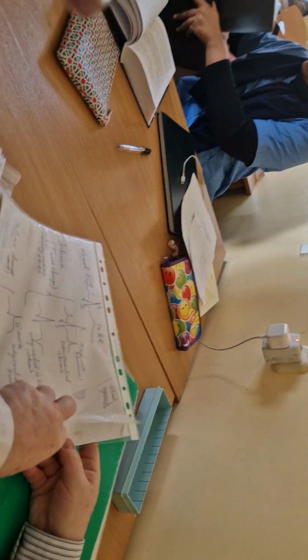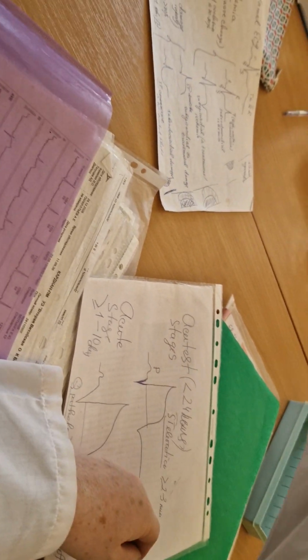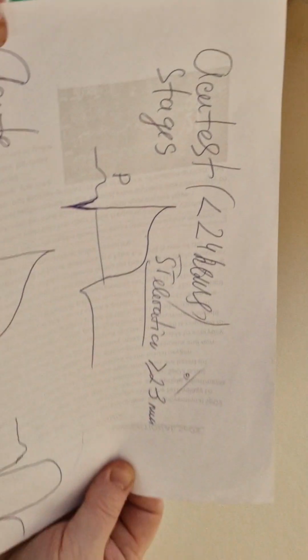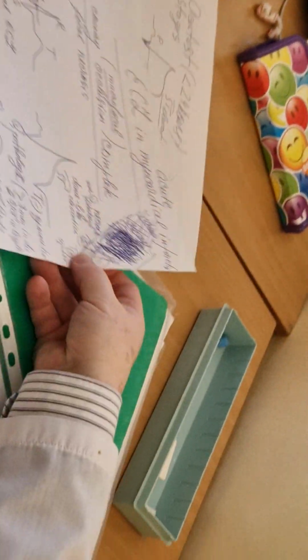Pictures, and I write. It was sometimes what stages of infarction: acute, and on this side, the cicatrization stage. So if you want one such picture, an infarction in the acute stage, typical macrofocal.